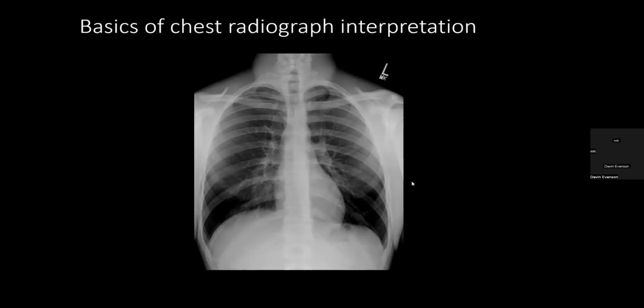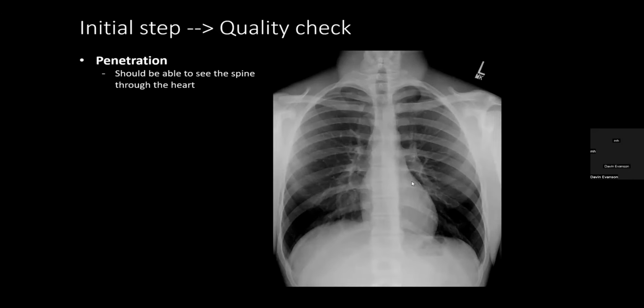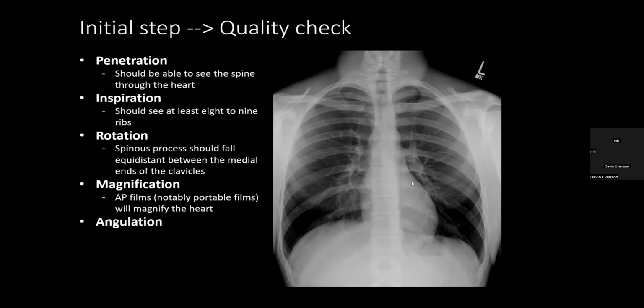We talk in much more detail about how to read a chest radiograph, different ways to do it. The Felson's way, the A, B, C, D, E. The approach is going to be shown here, looking at the different compartments. The most important thing is you do it in a systematic way. The first thing you always start with, quality check. Make sure you have the right patient and look at the parameters of penetration, inspiration, and make that assessment. Was it a good study or not?